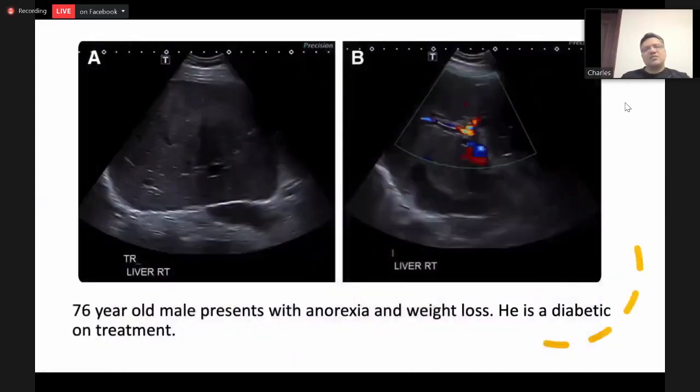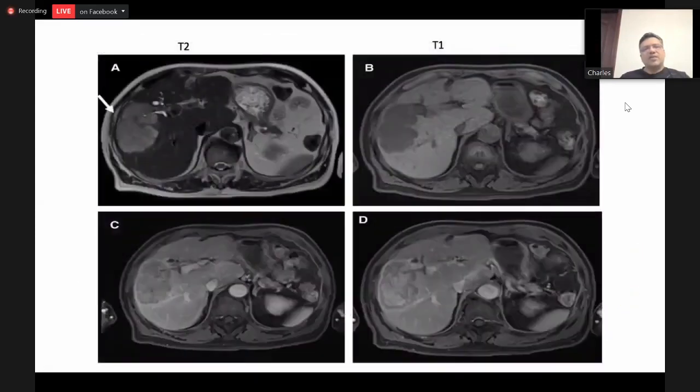Patient with non-cirrhotic liver. You're seeing a heteroechoic lesion with distal IHBRD, and if you look carefully, you can make out some surface retraction here. So you're seeing a lesion with distal IHBRD, surface retraction, and in the arterial phase a peripheral enhancement. Again, unlike the hemangioma, you can see that there's a continuous peripheral enhancement here. It's not nodular or globular like the hemangioma, and it's not similar to the aorta.